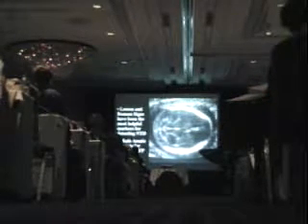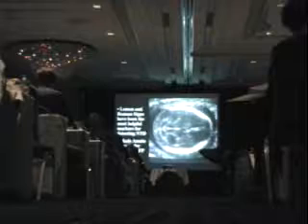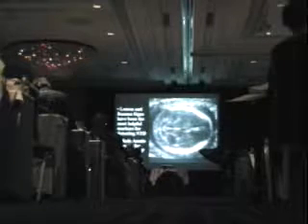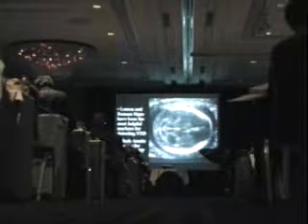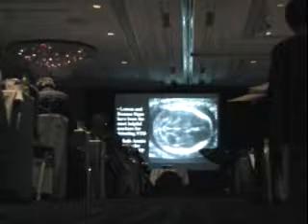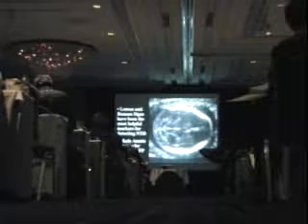You can have a lemon sign, which is this sort of lemon-shaped skull, although that can be seen in normal fetuses, so that certainly is not a sign that there's definitely an open neural tube defect. But the fact that the cerebellum wraps around the brainstem like a banana, that is not normal. That can never be normal. And that is definitely an indication that there is a neural tube defect someplace, and you just have to go and find it. And note also that there is obliteration of the cisterna magna behind that curved cerebellum.